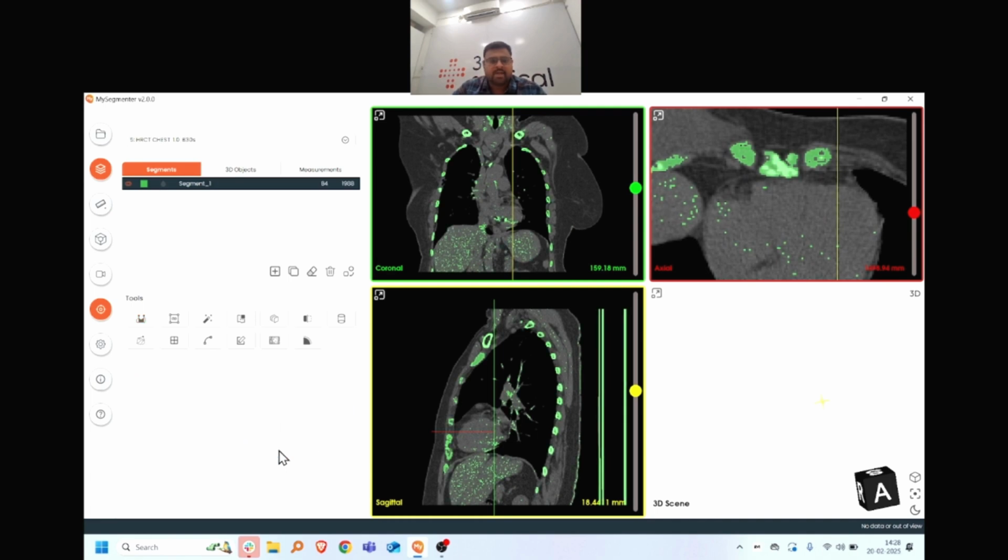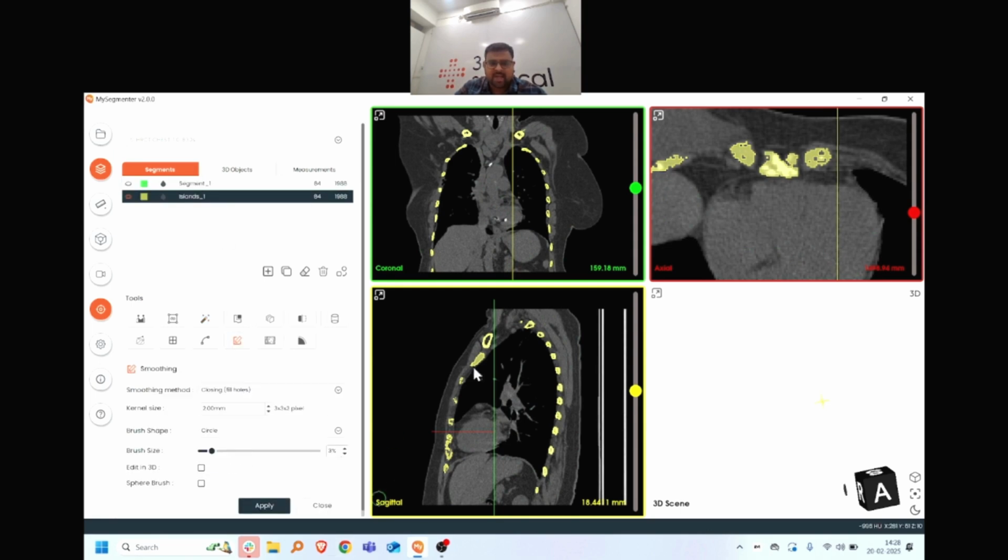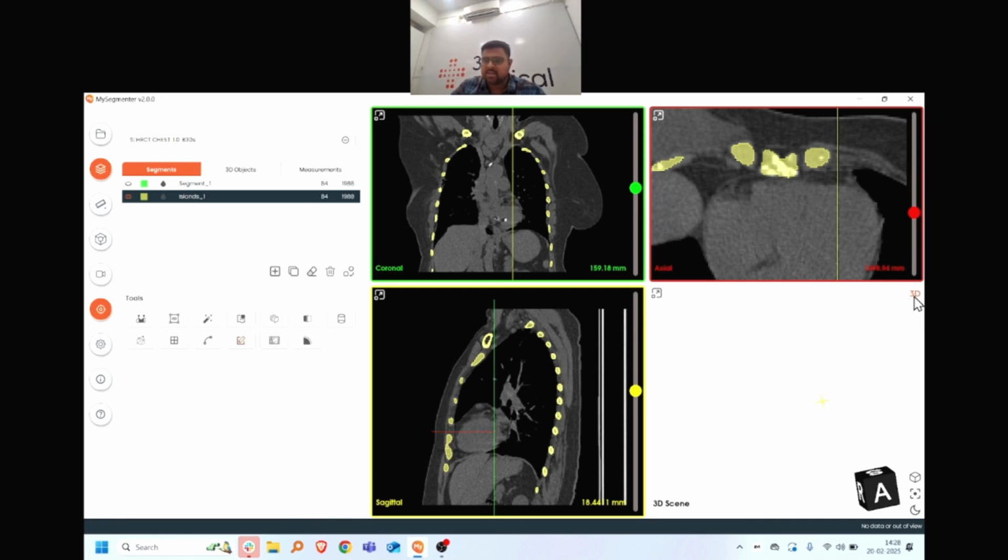So we'll hit apply. And before going to calculate 3D and all, I'll use this island effect so that it will eliminate all these distorted pixels from the segmentation. And then maybe closing of the gaps so that the small gaps can be closed, and I'll have a better picture when I create the 3D reconstruction, and maybe a little bit of joint smoothing so that the model will appear more channelized and more clear. So that is done, and then let us calculate this 3D here.